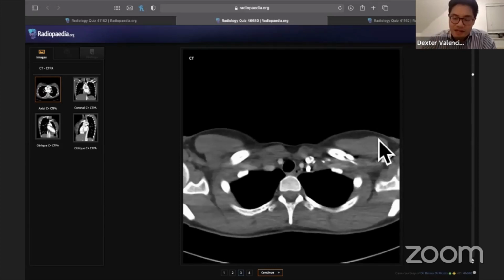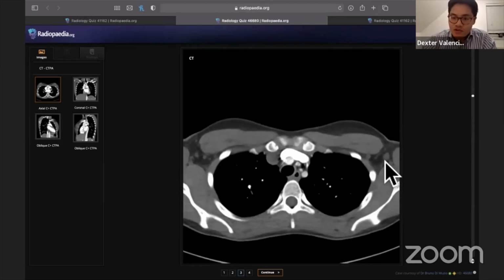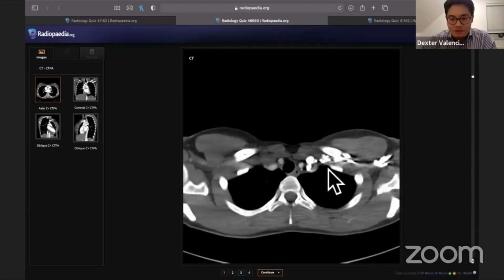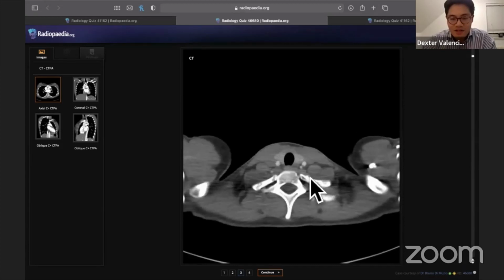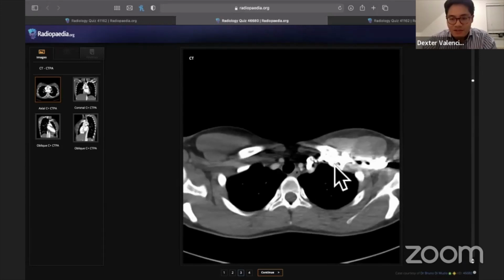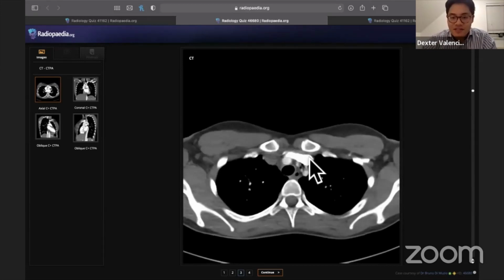So this patient, on their left arm, probably has a cannula. We've injected some contrast and we can see that because contrast is really bright, it looks a lot brighter, similar to bone, and it's passing into this vessel, which is a vein. It's outside the rib cage, so this is going to be the left axillary vein. And we know that once the axillary vein passes the first rib, so we can count that. So if we say that's the first rib, we follow that round, keep following that round. About here is where the left subclavian vein is going to enter.